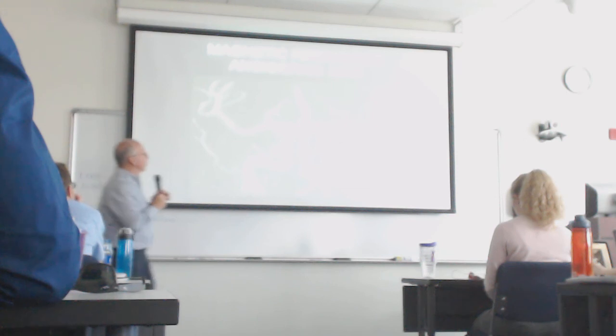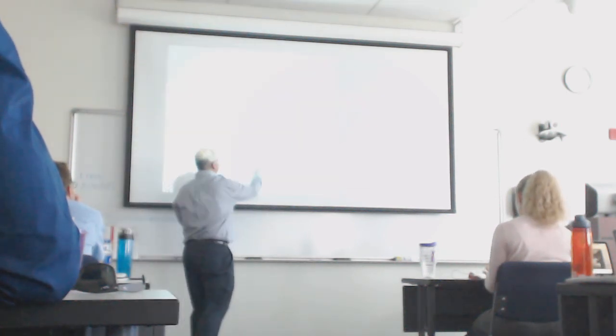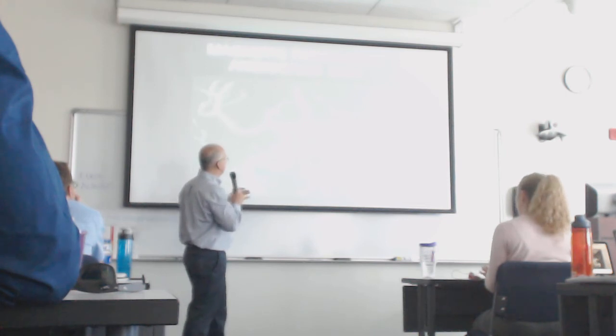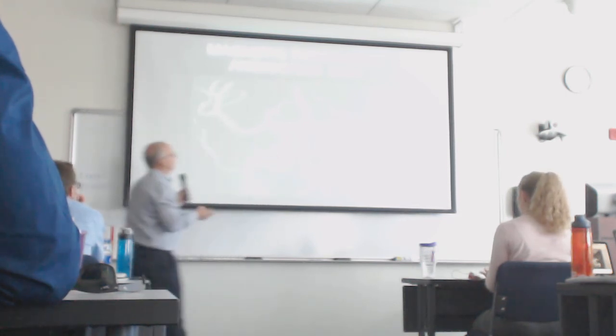Now here's an MR angiogram. Notice how on this one the blood vessels are white. Here the blood vessels are white. And now you've got this aneurysm sticking off here.